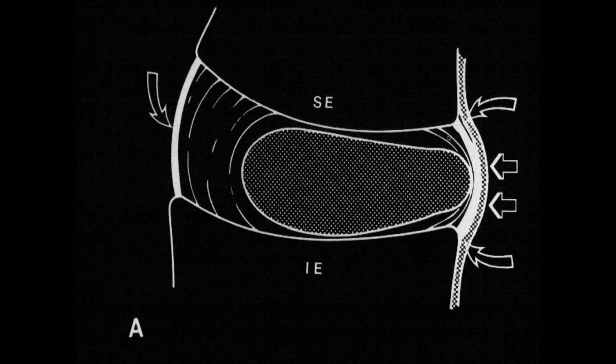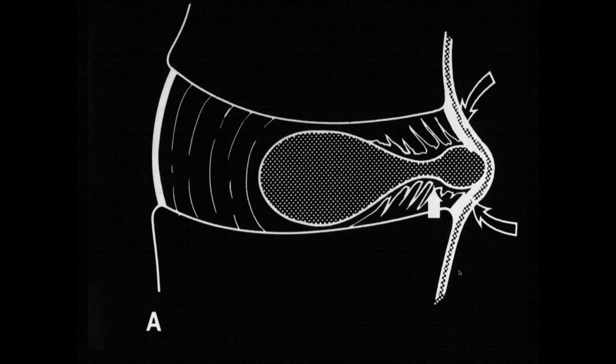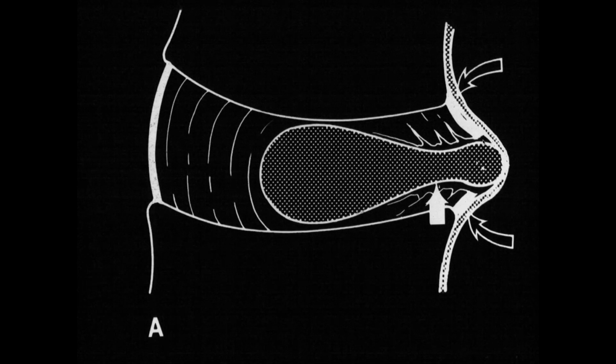Here we can see the different annular fibers and Sharpey's fibers around the periphery. And here we can see that the annulus is intact and would be watertight. This is the posterior longitudinal ligament here. That's further extrusion or herniation of nuclear material. And here we're actually almost going through the annular fibers, but not quite. Posterior longitudinal ligament is intact. Here it's extended all the way through the annular fibers. And therefore, if you have fluid here, it could leak out into the extradural space. So this would be non-contained, and the others would be contained.